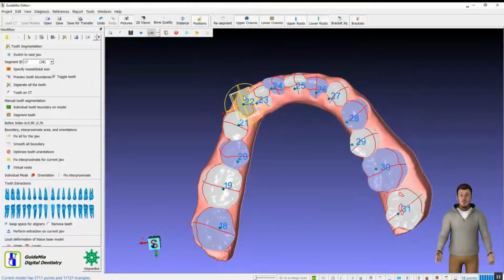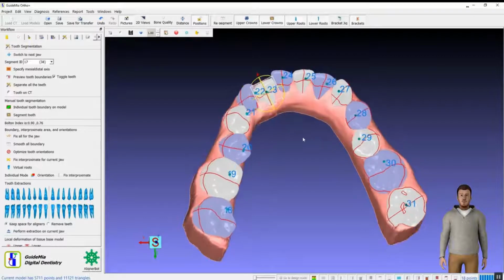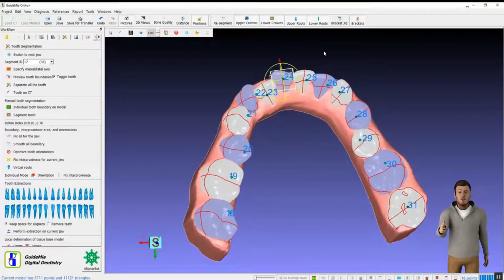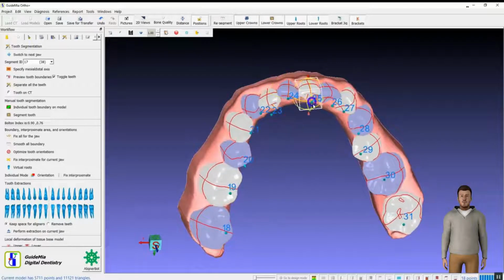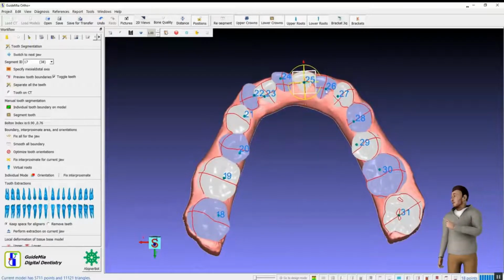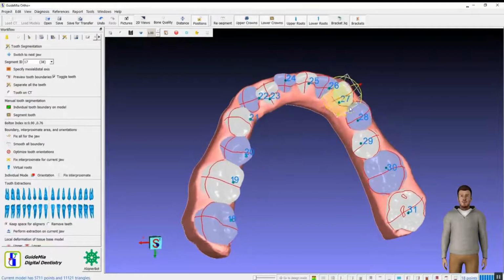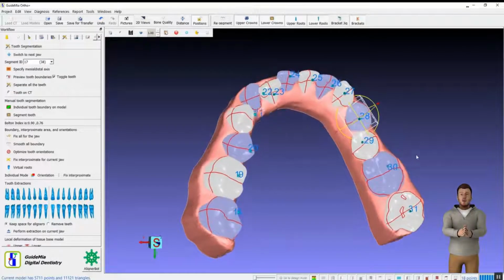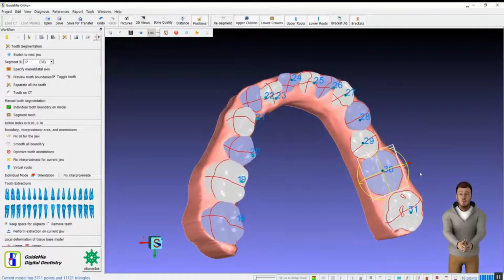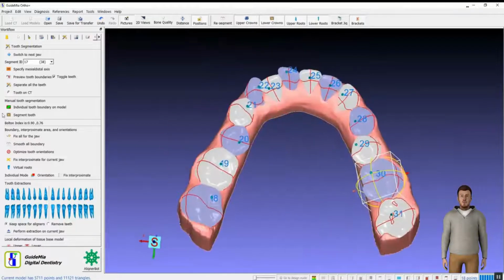Once all the roots are segmented, we can move on with initial tooth setup. Turn on the model, and adjust the occlusion plane and arch curves. Adjust the arch curve width and curvature, or adjust individually. The arch curves are supposed to be at the buccal side at this time, meaning the target position of the buccal side of the teeth. We can move the entire curve back or forth, depending on how we want the two jaws to be positioned in an articulator. We can change this relationship. For example, we can move the upper curve buccally, or the lower curve lingually, depending on the desired treatment plan.